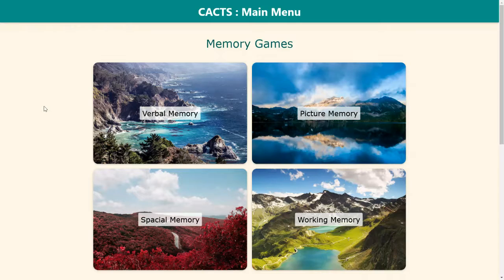The CACTS is a web-based system that seeks to not only rapidly test an individual's cognition via mini-games, but also detect and analyze contextual information that might affect the user's test performance and test-taking ability during the time of testing. By utilizing the latest and responsive web technology, we are able to deploy and test the system on virtually any modern web-enabled device, touch-based or otherwise.